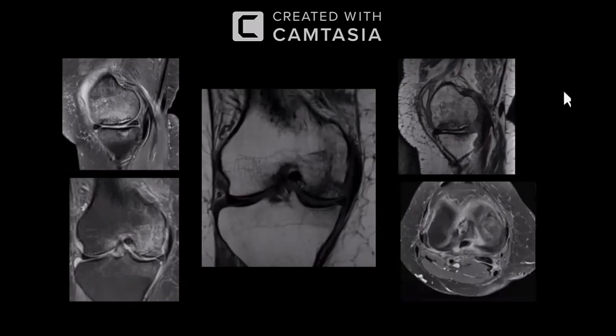So I'm suspecting fracture. The fracture involves the articular surface of the lateral femoral condyle. So I'll inform this finding to the referring orthopedician for further management. And I'll also scroll through all the images to look for any other ligamentous injury, and whether it's a pathological fracture secondary to any bone lesion as the patient is elderly.